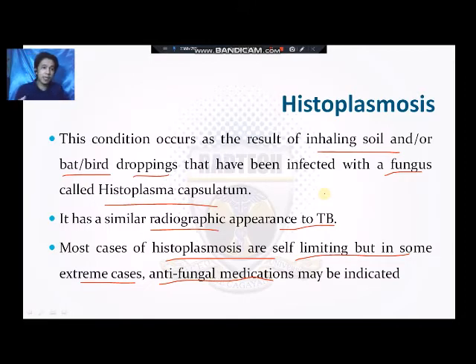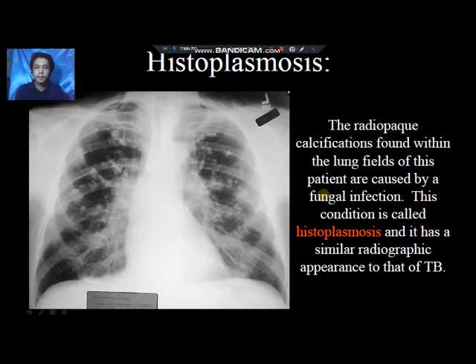Okay, self-limiting, that means magka-infect si patient, pero wala siya signs and symptoms, and then the condition will just go away. Mawala ra siya. Basically, our immune system just fights off the fungal infection without manifesting any signs or symptoms. Okay, so radiographic appearance, radiopaque calcifications found within the lung fields of the patient are caused by fungal infection.